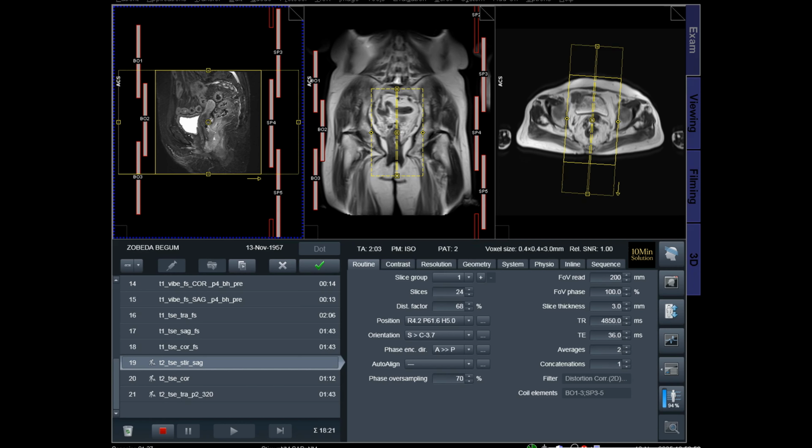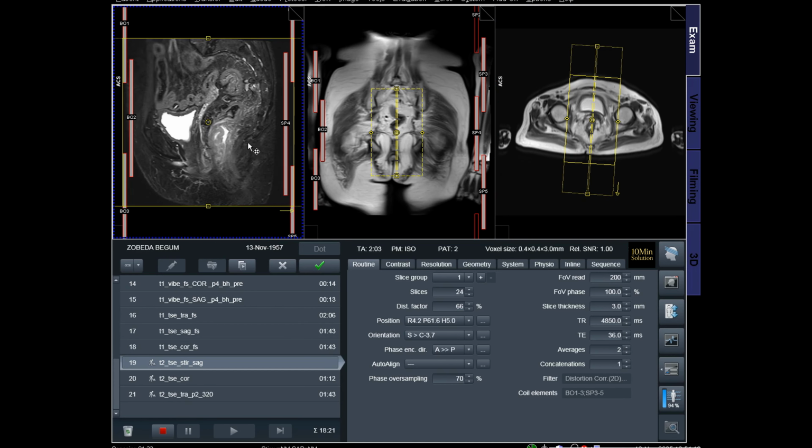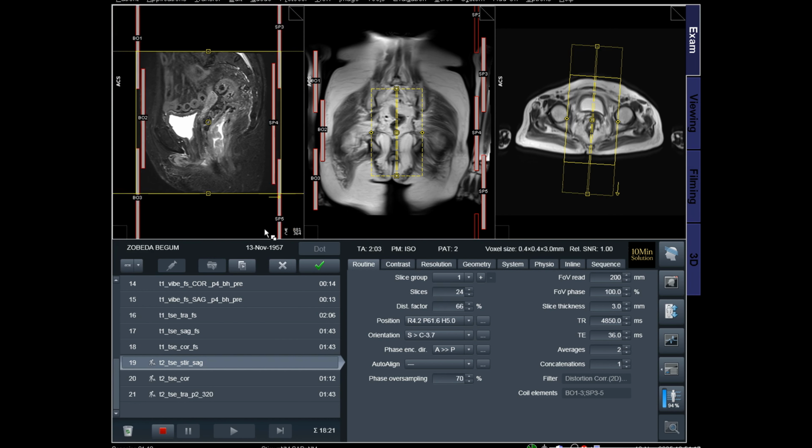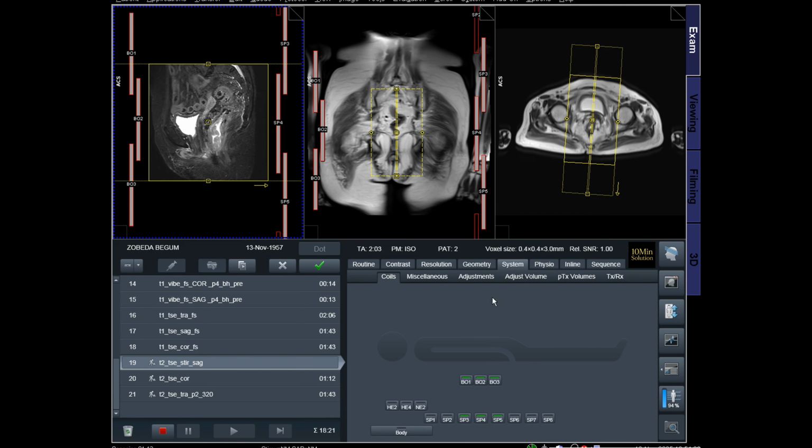Let's begin. T2 Sagittal Planning. Plan the sagittal slices on the axial plane and align the positioning block parallel to the linea alba and median sacral crest. Verify the positioning block in the other two planes. In the coronal plane, ensure an appropriate angle that parallels the lumbosacral spine. Make sure that the slices cover the entire pelvis, ranging from the right acetabulum to the left acetabulum.